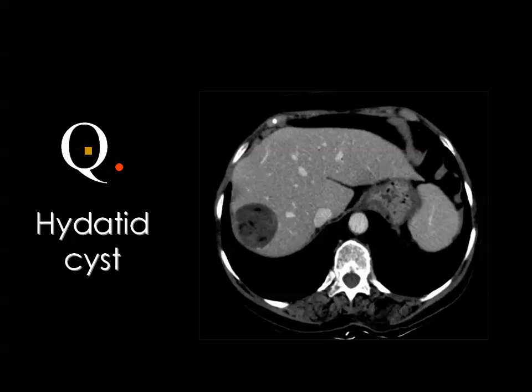And many times you can write in the report that this is, and I hate this word, a benign looking lesion in the liver, and it may require a biopsy to confirm the diagnosis. But this is, in my opinion, not a solid lesion, and it is on the cystic aspect of the hepatic lesions. It is not a simple cyst, and it is not an abscess, and it is not a hemangioma. Then the remaining will be hydatid, which can be considered.